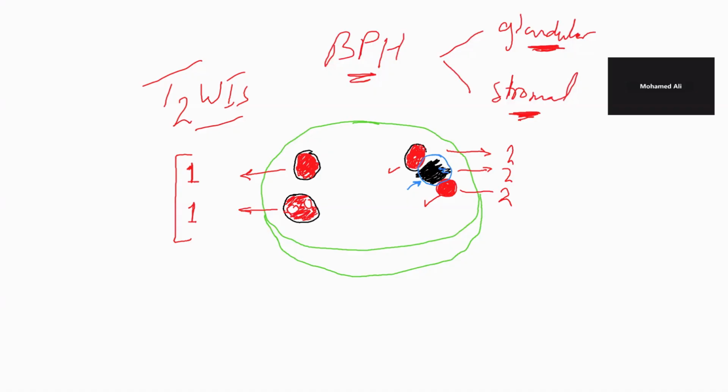If we have a patchy area, sometimes called a charcoal area, an ill-defined charcoal area, different from the background and away from the nodules, this one is considered as score 3 on the T2 weighted images.